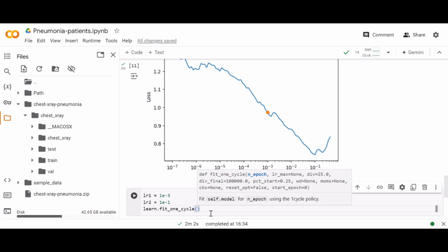Because our model is big and complex enough, we can keep these epochs to a minimum. Between 4 to 10 will be appropriate. I'm choosing 4 because of the time limitations. You can play around with this and choose an appropriate number of epochs on your own. This is a hyperparameter as well.